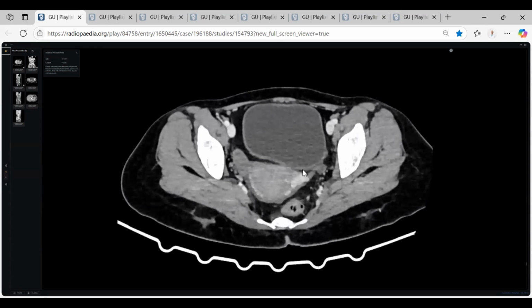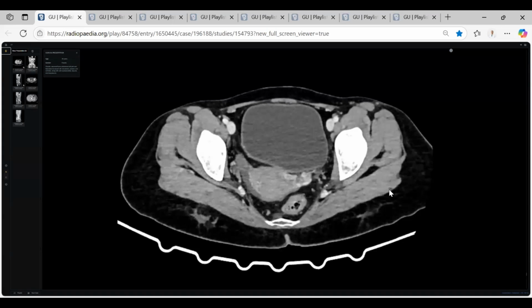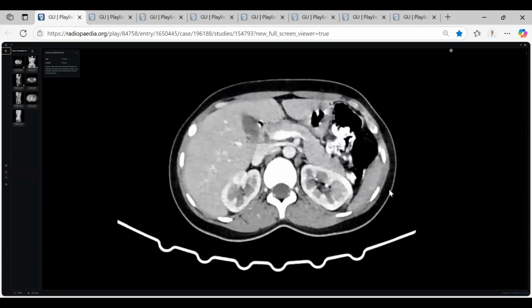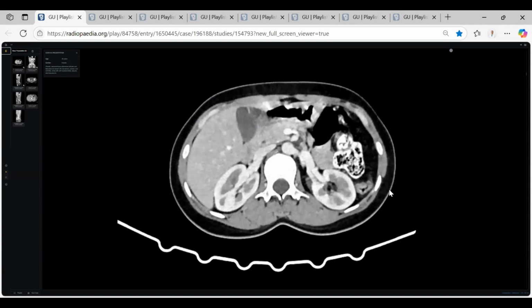Thank you, doctor, so much. So, my colleagues, this is a fantastic case of double findings. The first pathology is nearly in the lowest slice, the cause nearly in the most upper slice. Fantastic, brilliant exam, and very easy.